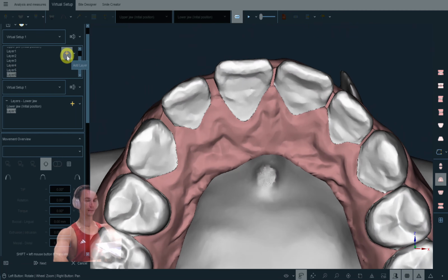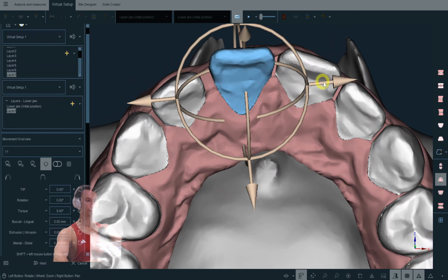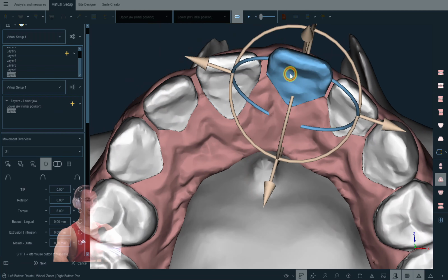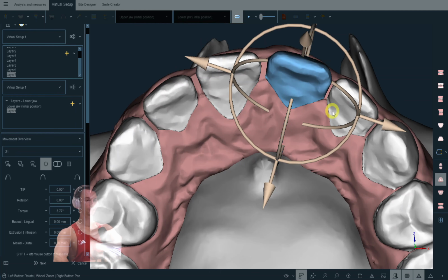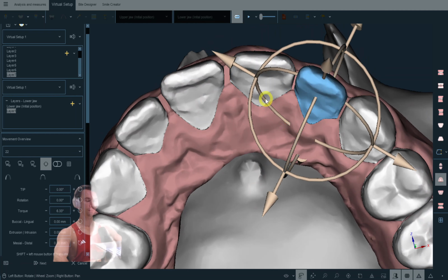And then we work with 2 incisors at the same time, not 3. We always need anchorage. I mean, we can move the teeth to the palatal side, but not mesodistally.